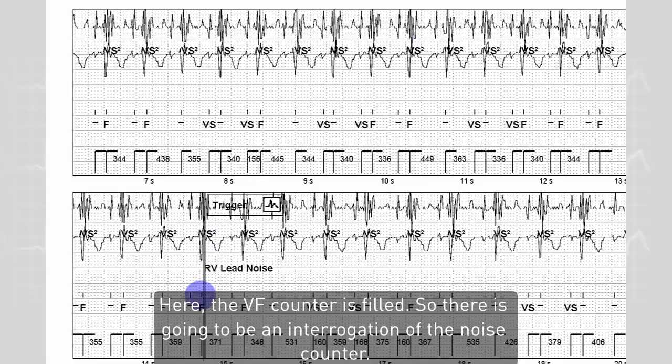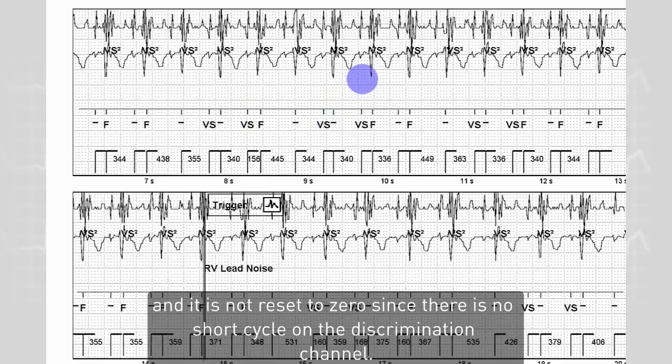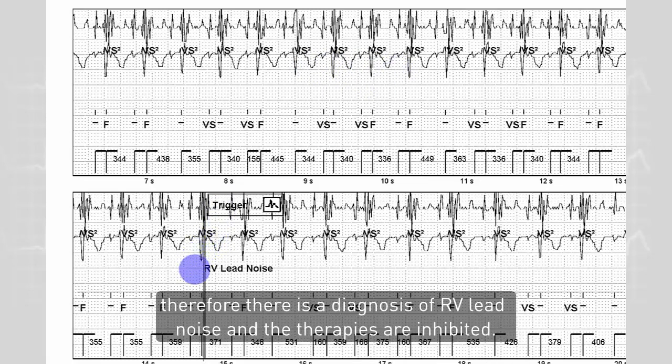Here, the VF counter is filled, so there is going to be an interrogation of the noise counter. The noise counter has been incremented by 1 for each of the short cycles on the bipolar channel, and it is not reset to 0 since there is no short cycle on the discrimination channel. Therefore, there is a diagnosis of RV lead noise, and the therapies are inhibited.